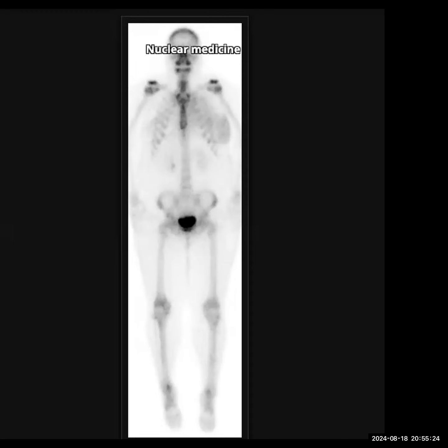I'm coming down to the thoracic region, where I can see an area of uptake in the chest region anteriorly. If this is a female patient, I would be thinking in terms of a breast carcinoma with lymphangitic uptake. That would explain this.